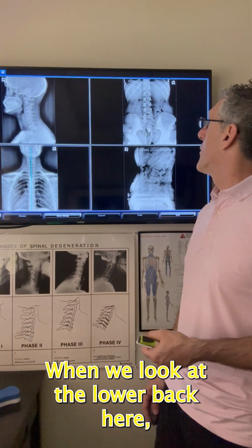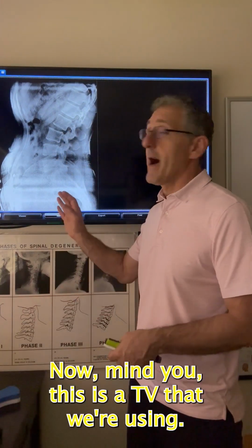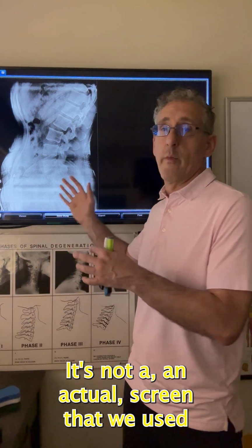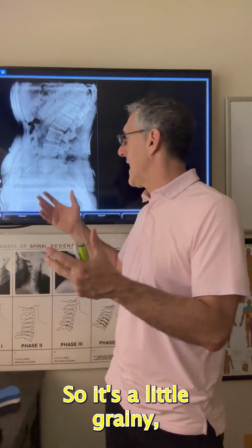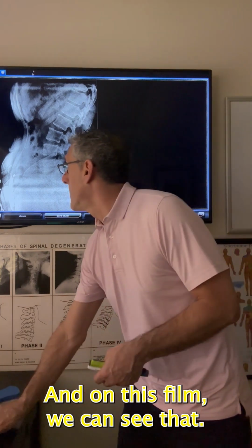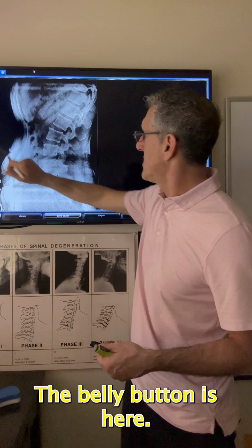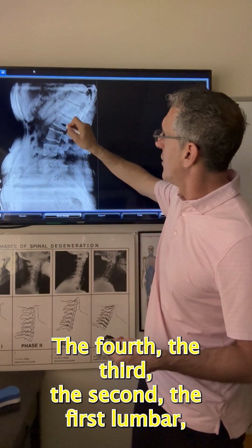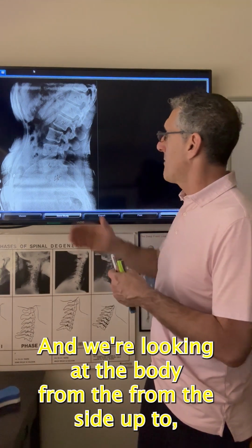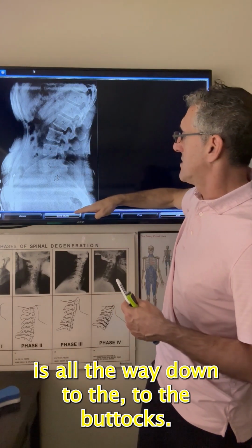When we look at the lower back here, we can see here's the lumbar spine from the side. Now, mind you, this is a TV that we're using. It's not an actual screen that we use to diagnose off film, so it's a little grainy, but we can see what we need to see. On this film, we can see that here's the sacrum, here's the tush down here, the belly button is here. Here's the fifth lumbar, the fourth, the third, the second, the first lumbar, the 12th thoracic, the lower part of the rib. And we're looking at the body from the side, from the lower part of the chest all the way down to the buttocks.